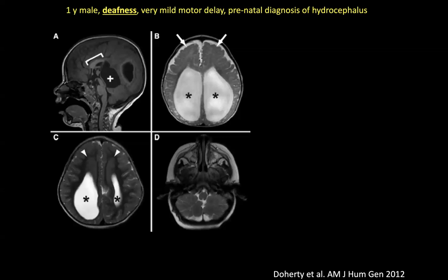You have short dysmorphic corpus callosum, midline cyst, bilateral nodular heterotopia, and polymicrogyria. And also, together with this dilatation of the ventricles that we call colpocephaly, that is secondary to the small corpus callosum, we have this characteristic inferior cerebellar dysplasia.